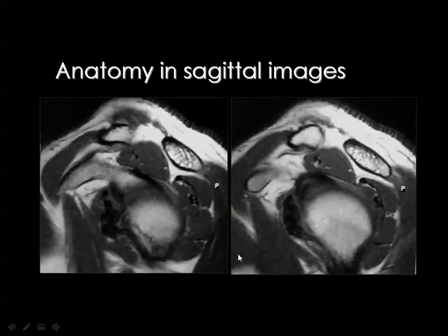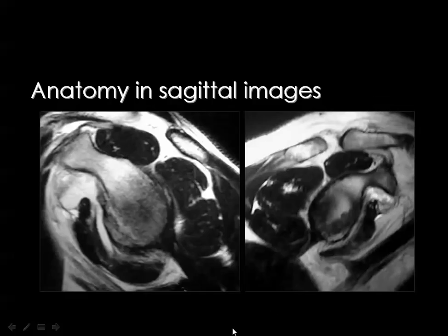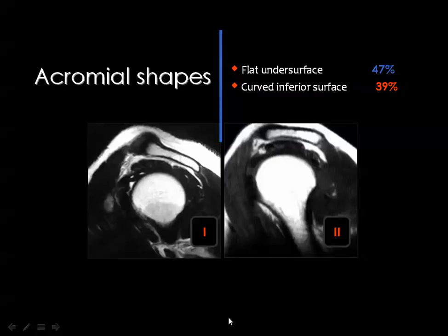Then these are sagittal images, and this is the coracoid process, supraspinatus, infraspinatus, teres minor, and the subscapularis is located anteriorly. Once more, this is the acromioclavicular joint, supraspinatus, infraspinatus, teres minor, and the subscapularis, and here is the coracoid process. Then this will be the clavicle, and this will be the coracoid, the acromion, the clavicle and the acromion. One of the important values of the sagittal images is to evaluate the shape of the acromion, and we have 4 shapes for the acromion.